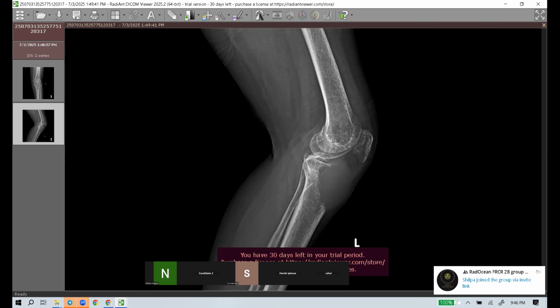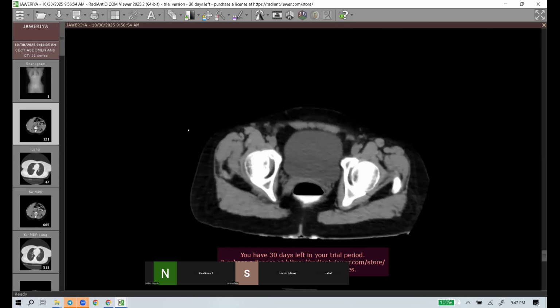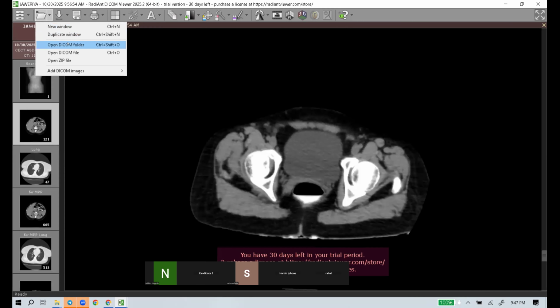Another differential you could have also considered is myeloma. This was a myeloma case. And otherwise lymphoma. Every reasoning was good enough, so that was fine. So I'll just show you the last case.